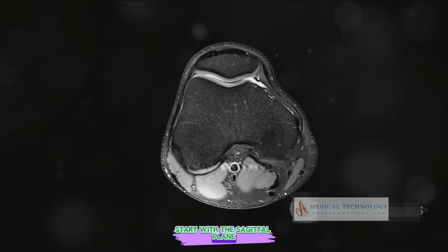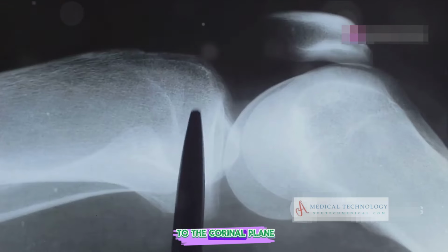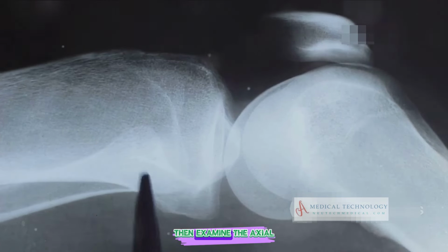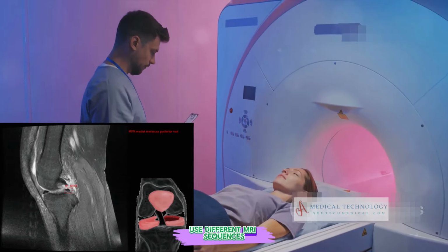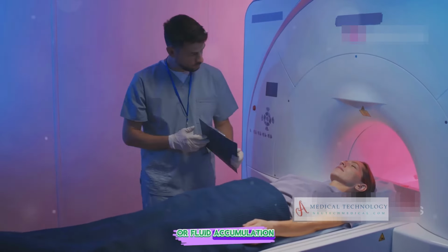Start with the sagittal plane to check the alignment of the bones and any abnormalities in the cartilage, menisci, and ligaments. Move to the coronal plane to evaluate the menisci, collateral ligaments, and overall joint space. Then examine the axial plane to focus on the patella, quadriceps tendon, patellar tendon, and the trochlear groove of the femur. While navigating through these planes, use different MRI sequences to confirm findings and understand the nature of any abnormalities such as inflammation, tears, or fluid accumulation.